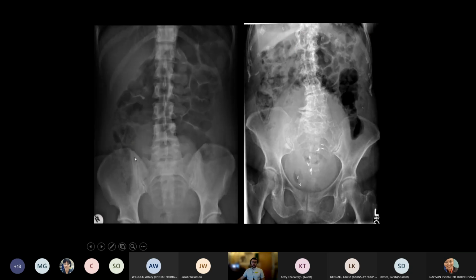This is an ovarian mass here. It's quite lobulated. It's regular and smooth for the most part, but it's not all the same oval shape. This is a continuous egg shape all the way around. So this is a tumour here, an ovarian tumour. This is just a distended bladder, and that's how big they can get. They can be surprisingly large. The key here is shove a catheter in and see if it goes down, and if it doesn't go over time, then you've got to suspect that there's something else more sinister at play.